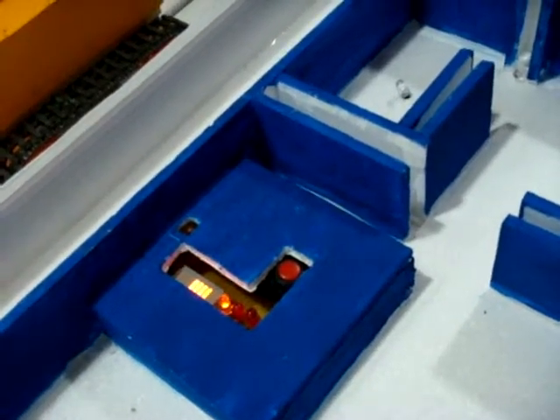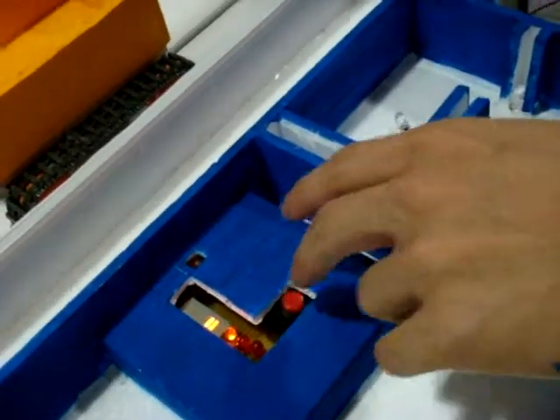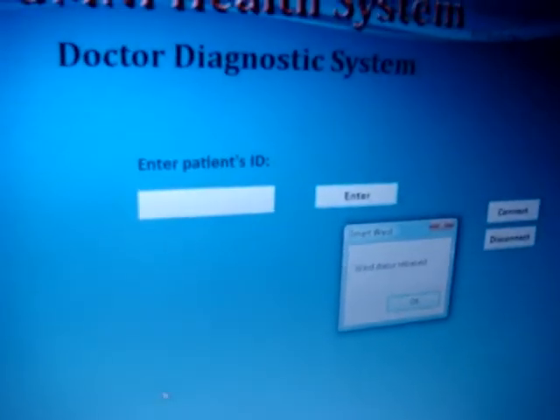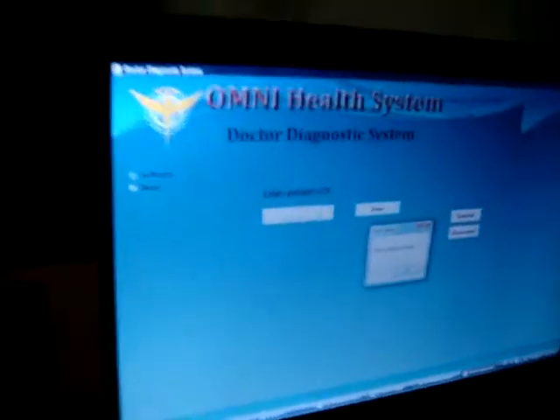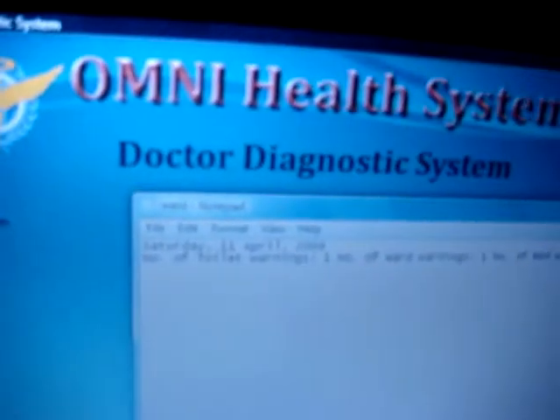Upon changing back into the day system when the night has ended, information of all the warnings in the night will be sent using the IO ports and RS-232 to the doctor diagnostic system, stating what status is retrieved, and it will be recorded as shown.